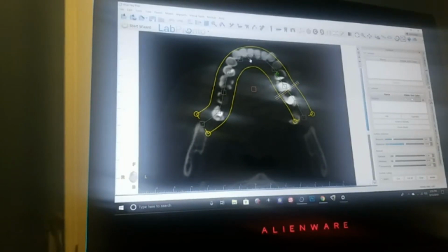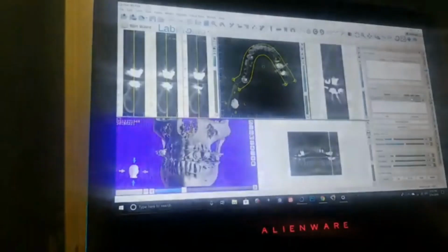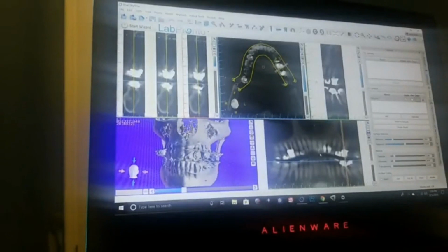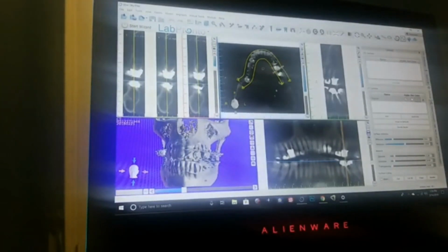And then you have this yellow line that's basically taking over on each end of your teeth. What you're looking at here, how do I know what exactly I'm looking at? Okay, let's just concentrate on that, and then I'm going to go in that area. There's a bunch of images that you have.